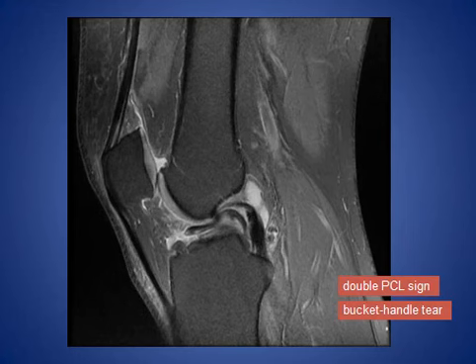The second sign is double posterior cruciate ligament sign.